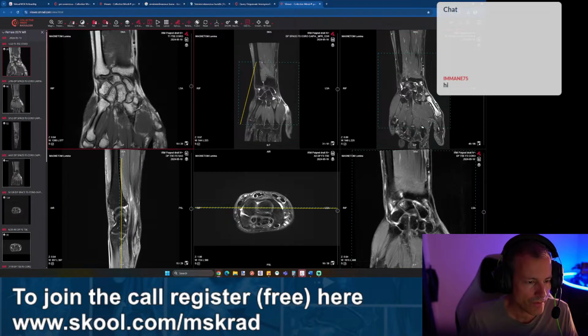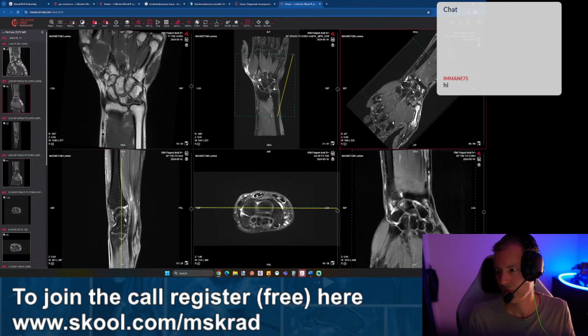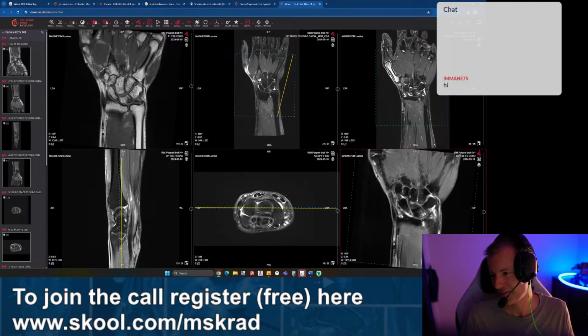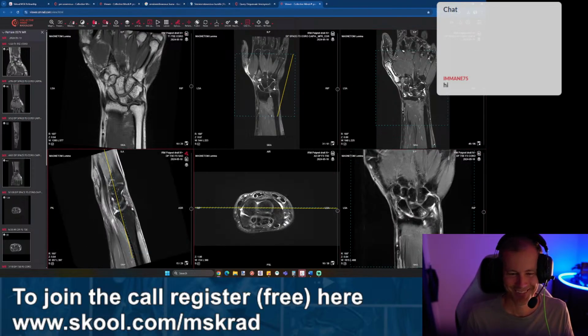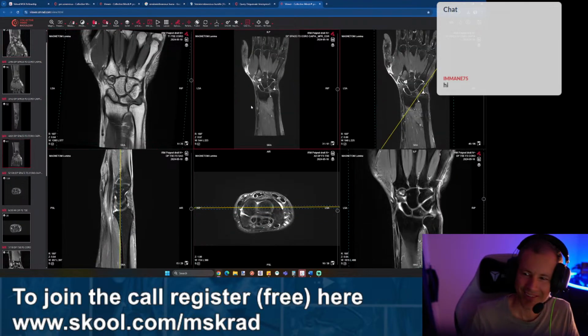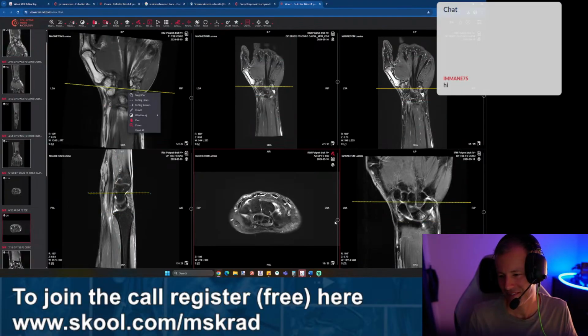Okay, and there's a 57-year-old with query for De Quervain tenosynovitis. Okay, so the French always have things upside down for some reason. Is this the same in Spain, Carlos? Yeah. I don't know why, but I think it's something about the providers.